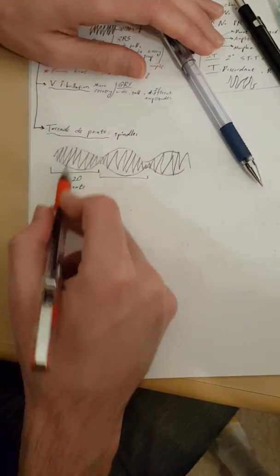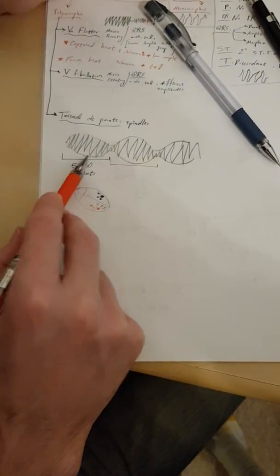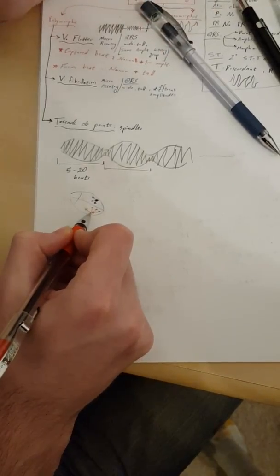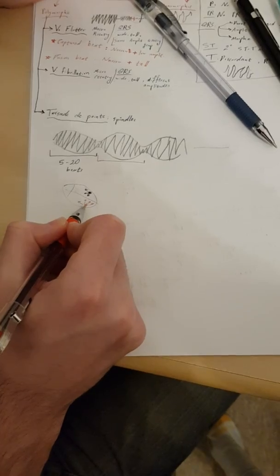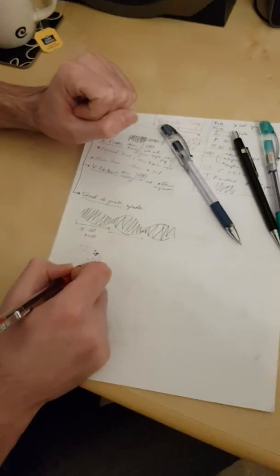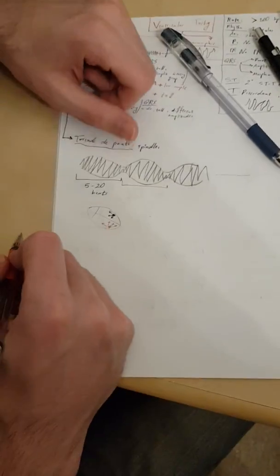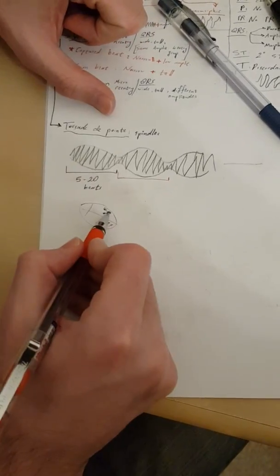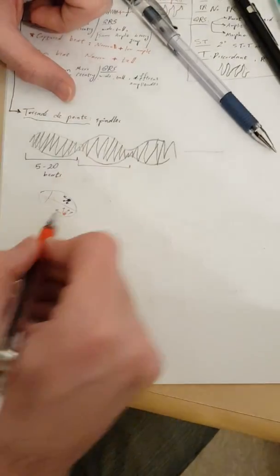Now this is, I can say, the last stage before death, before asystole, because someone is actually just getting lucky to get another focus to start giving the impulses, to initiate the rhythm. Because if this one gets exhausted, then you might not have any point that will take over, and that's it. Then it's asystole. So every point starts giving you the beats and then dies out.